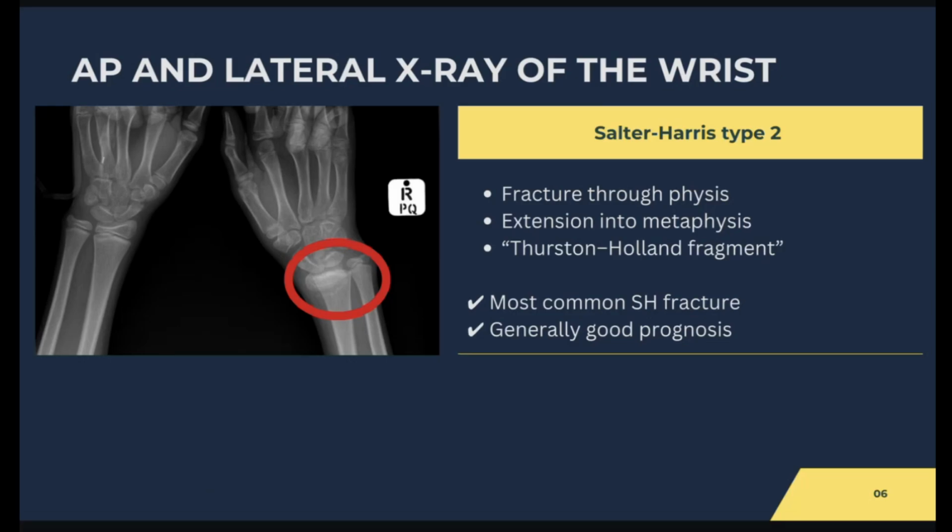I can just see some people still typing. So this is the Salter-Harris type 2 because the fracture is through the physis and it extends into the metaphysis. And this is the most common Salter-Harris type fracture and usually has a good prognosis as well.